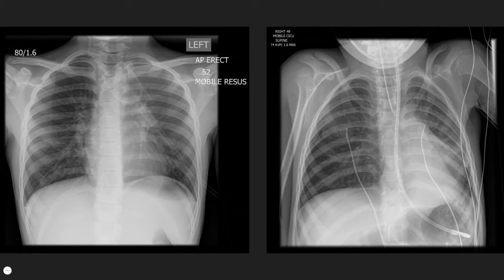On the right image, we have the chest x-ray of a 4-year-old with cerebral palsy who has been intubated for respiratory distress and has reduced air entry on the left side. There is a sail-like opacity behind the heart in keeping with left lower lobe collapse. The likely underlying cause in both patients is mucus plugging. Another common cause in pediatric patients is foreign body aspiration. Malignancy is an uncommon cause compared with adults.